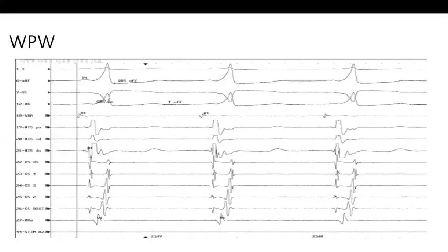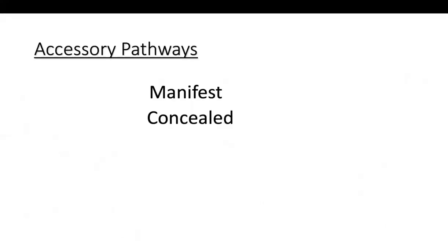Regarding V2 in accessory pathways, V2 sometimes will tell you that the location suggested by V1 might not be accurate. The transition between V1 and V2 is very important in the presence of an accessory pathway. If you get a negative V1 and a clearly, highly positive delta in V2, that is really pushing toward the left side.